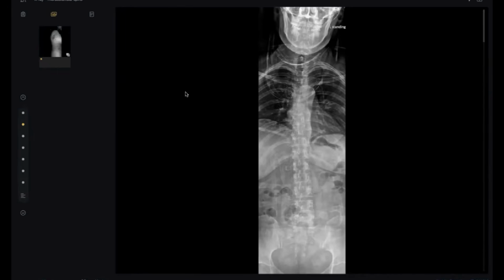Excellent. I'm evaluating the abdominal structures and visualized thoracic cavity. I don't see any free air or cavitary lesions. I don't see any abnormality overlying the psoas shadow. So in view of the thoracic spine findings, I'm thinking this could be a left paravertebral collection. What's your next step? I will proceed with the CT chest.